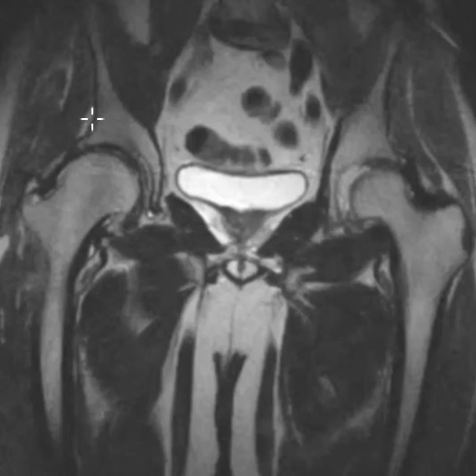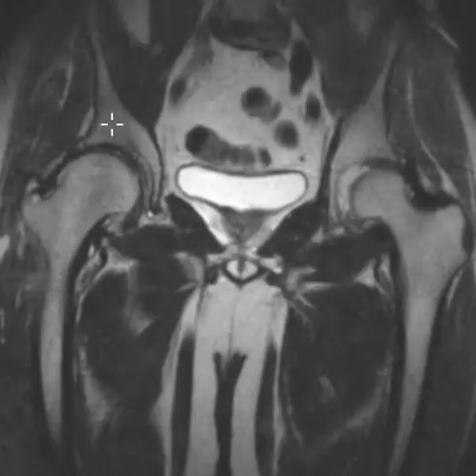They can also have what's called a pincer type, where the acetabulum is too big and large. It'll hang over and can pinch into the femoral head. Sometimes they have a combined form where they have this broad protuberance here and flattening, and they also have an acetabulum that's too large, and then we call it a mixed CAM and pincer type femoroacetabular impingement.